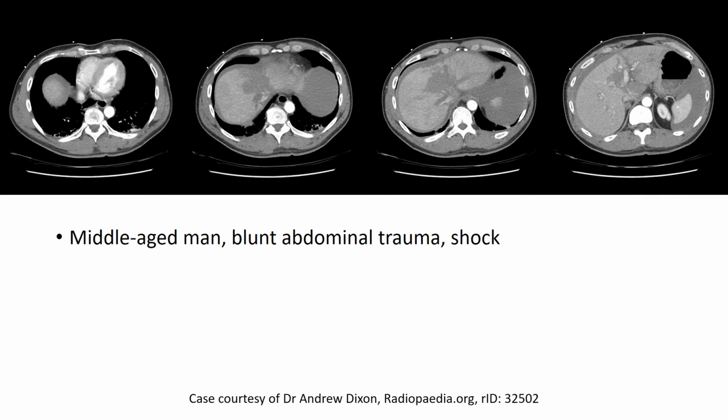Let's consider another case, this time a middle-aged man who suffered blunt abdominal trauma and is now shocked in ED. Pause the presentation to take a few moments to look at this sequence of 4 images and then present your findings. And this is something like what I would say.